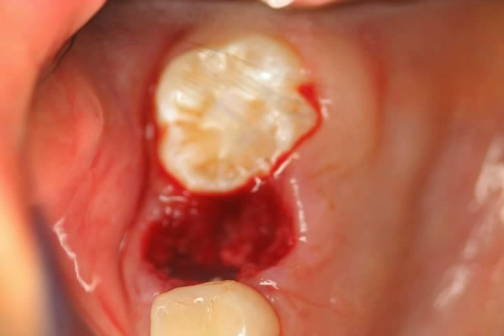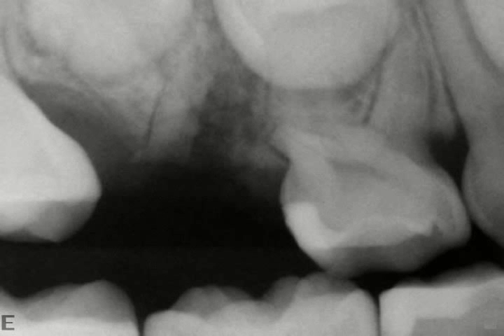This photo shows the extraction site of the second tooth right after it was removed. Even though the tooth is removed, the tooth behind the one removed is now completely uninhibited from moving forward, which is what it will do if nothing else is done. This x-ray is showing where the tooth was removed and the empty space. You can also see a tooth above the tooth that was removed.